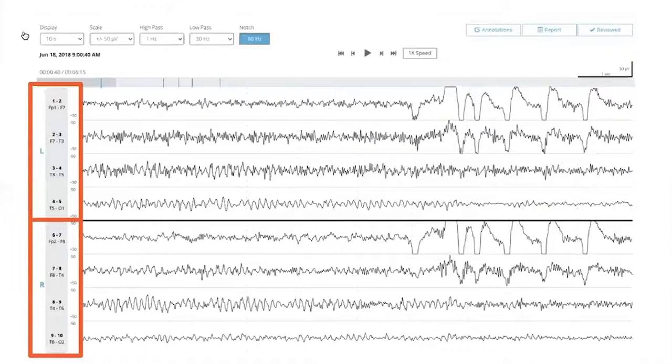But quickly going over some of the patterns that I think our new readers should be aware of. First of all, as Dr. Stern said, pay attention to left and right. Always see that the left is over the right channels. You will have 4 and 4. And sometimes pathologies can be confined to only one side of the brain, as you saw in the preceding slide.